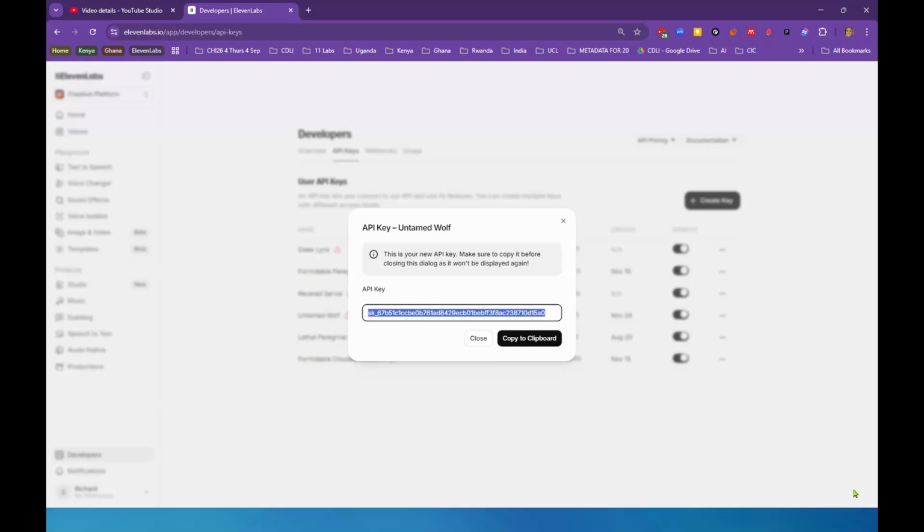Now I'm just going to copy to the clipboard because I'm going to go into Grid 3, which is also on my PC here, and create a link to the 11 Labs voice on Grid 3. However, your clients may be using a phone or a tablet where 11 Labs is not in the same place.